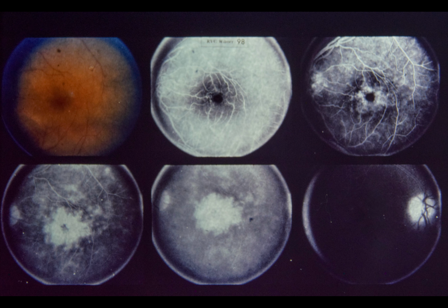Here are your questions. 1. What is the morphologic diagnosis visible on the fluorescein studies? 2. Name 4 conditions commonly associated with this morphologic entity. 3. What do you consider to be the likely diagnosis in this case? 4. What other ophthalmoscopic findings might one see in this patient utilizing indirect ophthalmoscopy?